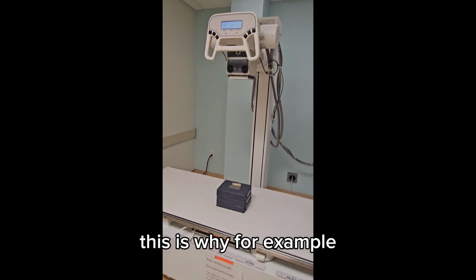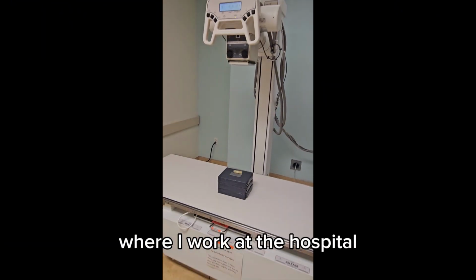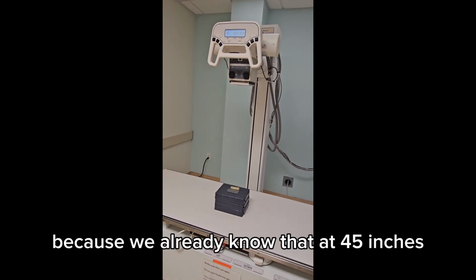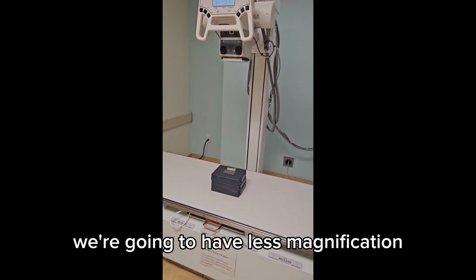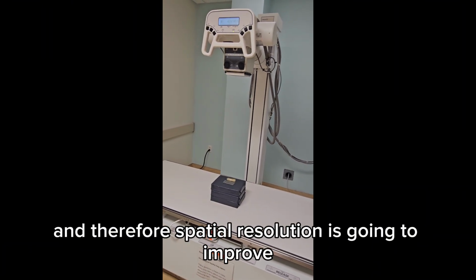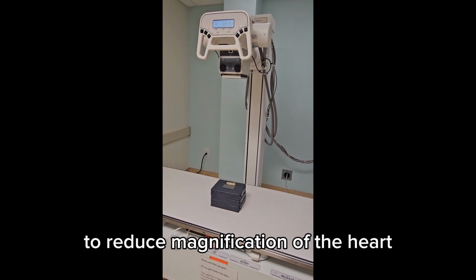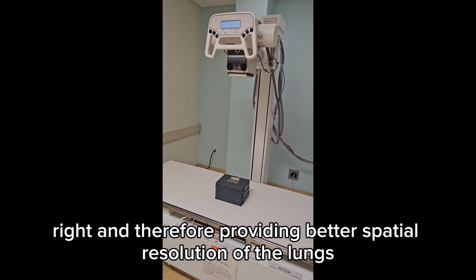This is why, for example, I take all my x-rays where I work at the hospital at 45 inches. That's our protocol. Because we already know that at 45 inches, we're going to have less magnification and therefore spatial resolution is going to improve. Why do you do a chest x-ray at 72? To reduce magnification of the heart, right? And therefore providing better spatial resolution of the lungs.